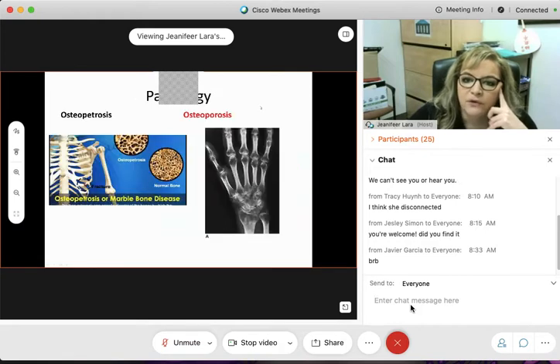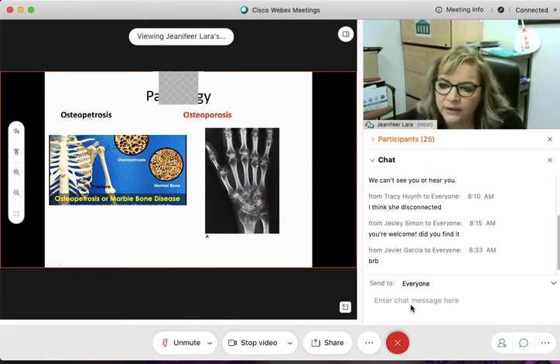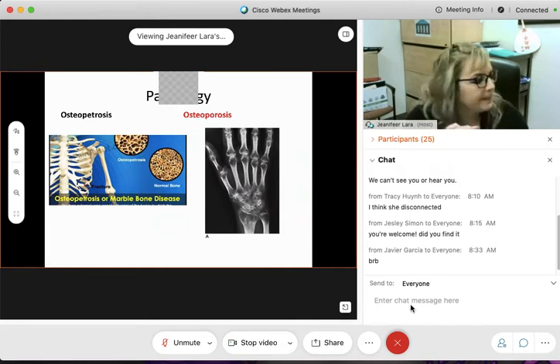Osteoporosis. Don't confuse osteoporosis with osteopetrosis. So osteoporosis looks like this. See how this is becoming dark? We didn't do anything magical with our x-rays. We didn't make this darker in our x-rays and this lighter for a reason. We don't have that capability. We do not have the capability to regulate our primary beam so that one part of a bone gets darker and the other part doesn't. So this is a revelation of pathology. So we start to see darker shades. Darker shades means radio-opaque or radiolucent? Daniel.